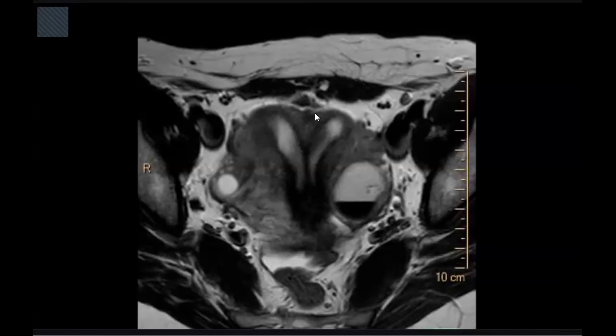This is less than 1.5 depth. So I'm thinking along the lines of a septate uterus. And next I would convey the findings to the gynecology team for the removal of the septum, and this will improve the fertility outcome.